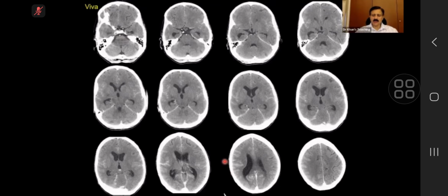You remember the FLAIR sequence where you have to differentiate, after giving contrast, whether it is leptomeningeal versus subarachnoid? Similarly here on the CT, they can show you a trick case. This is with contrast, and once you pick it up, there is bilateral symmetrical leptomeningeal enhancement.